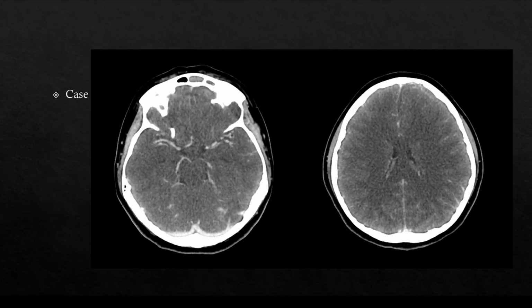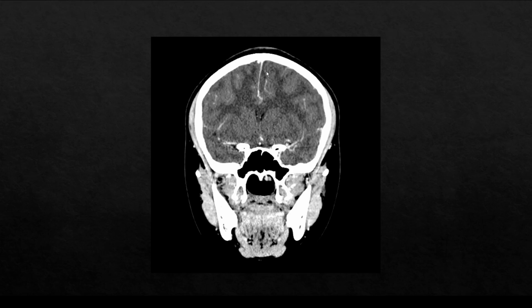In this young child, a different patient with frontal sinus opacification, again, if you look carefully at these images, particularly this image on the right, we see abnormal material extending along the falx. Again, reformats can be very helpful as we see this abnormal mass effect in the region of the falx. The falx is actually bowed to the right. Now, because this is extending along the falx, we know that this is a subdural collection, not epidural.